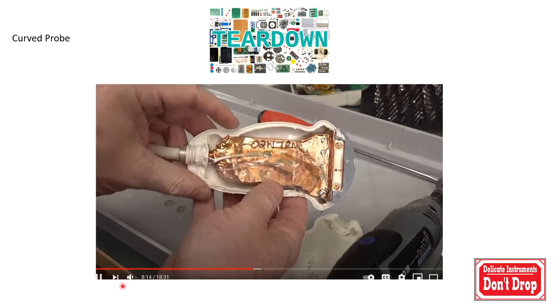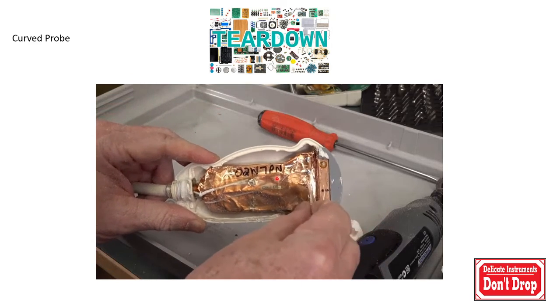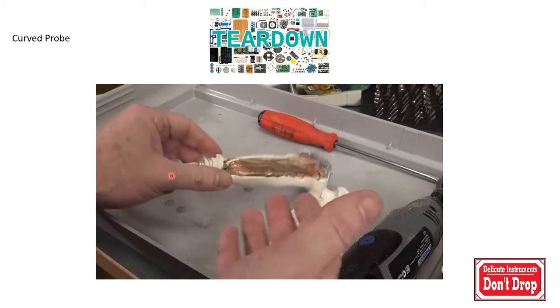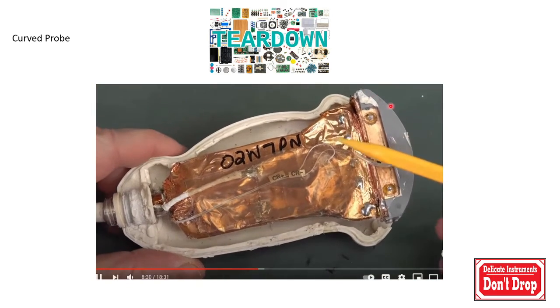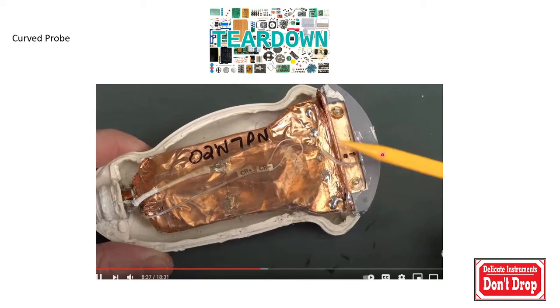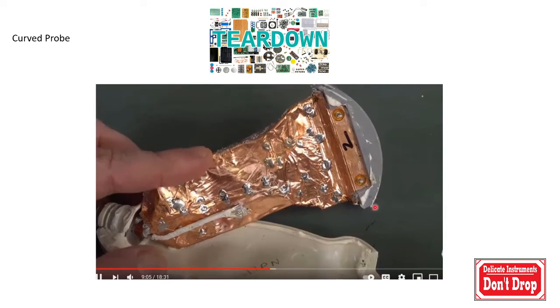Inside that, the piezoelectric crystal is not sitting here. All these are micro circuits, that is the long wire that is going. The piezoelectric crystal is situated exactly here at this curvature. It is at the tip. It is not inside, so it is very much exposed.